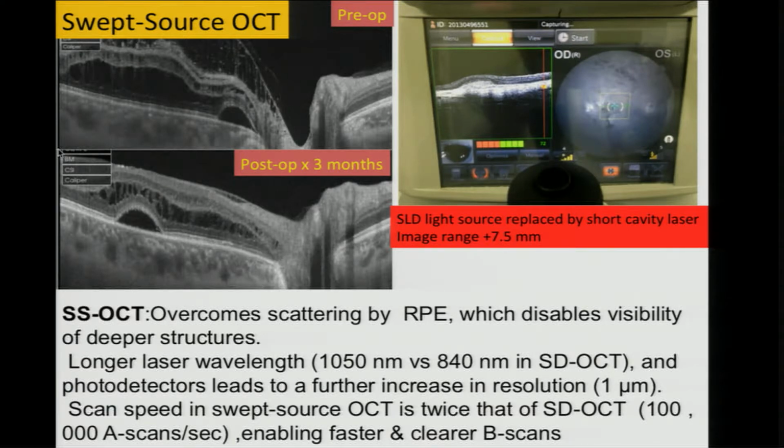same time. It's not that you have to move the camera closer to the patient, like in the Spectralis, where you have to move the camera closer to get the EDI line, moving posteriorly. It's not the case in swept source OCT. So you get a very good view right from the vitreoretinal interface. In fact, the premacular bursa can be seen if you have the dynamic focus function activated. And you can see right till the depth of the Haller's layer and even the suprachoroidal laminae.